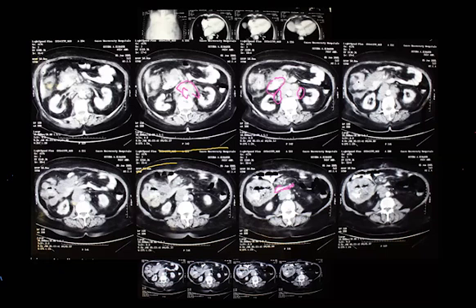So you're looking at the spleen. Yes, there may be something else in the spleen other than being diffusely enlarged. We've already seen this thing. What could there be in the spleen other than it being diffusely enlarged? Multiple heterogeneous lesions. Exactly. Ayat is saying it may have multiple heterogeneous lesions.